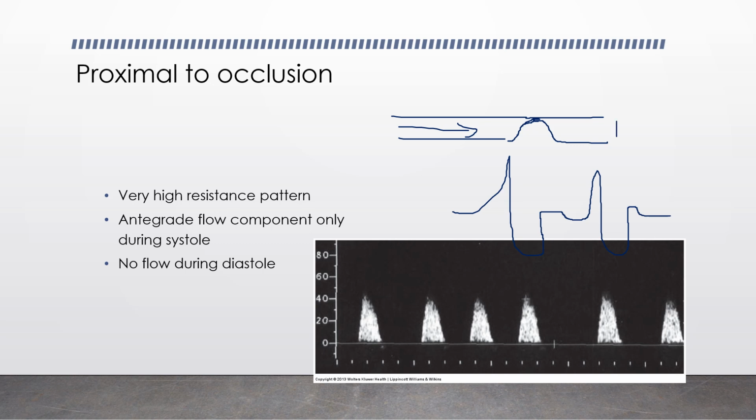What we're going to see is that my heart is pumping out blood. That blood is pumping down the vessel. It's ramming into this stenosis, and it can't go anywhere. And so you see that in systole, you get a brisk systolic upstroke here. Diastole takes it back to nothing, and then you have nothing until systole again. So this is like butting your head up against a wall. That blood just has nowhere to go, so it gets pushed forward and stops, forward and stops.